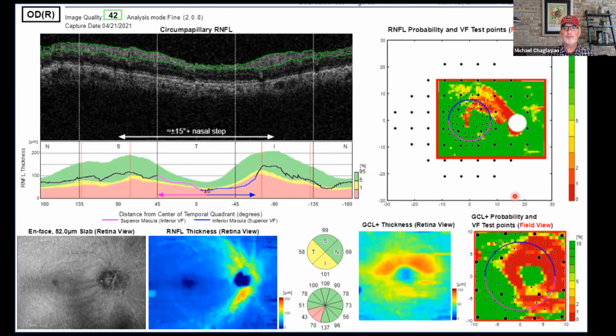And I'll show you that on the next slide. And then just to finish off this report here, Don, of course, helped identify for us how important doing 10-2 visual fields are and scanning the macular region is for early glaucoma. He has the ganglion cell map for the macular region, and everything in red here is abnormal on this probability plot.